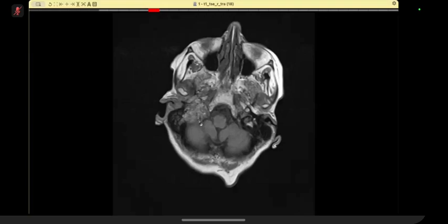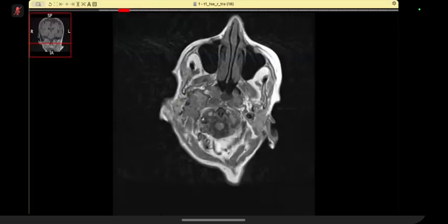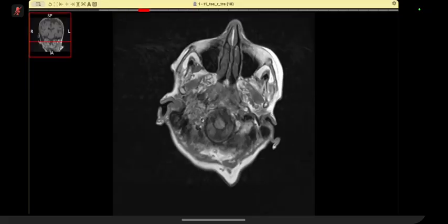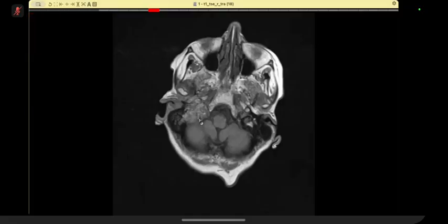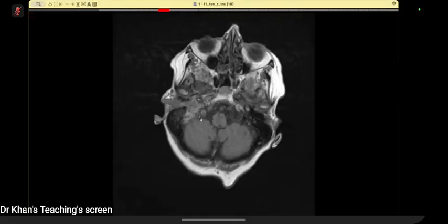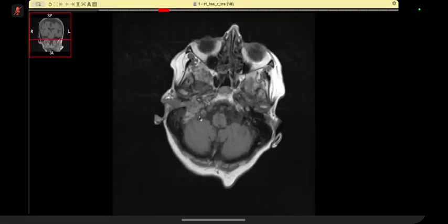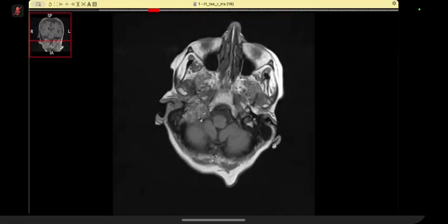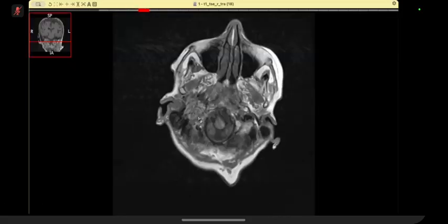If the patient has any symptoms of paraganglioma. So what kind of symptoms do you expect? I would like to see first extension into the tympanic cavity, as there is sometimes extension of the jugular tumor into the tympanic cavity. The patient could have tinnitus. Okay, thank you, sir.